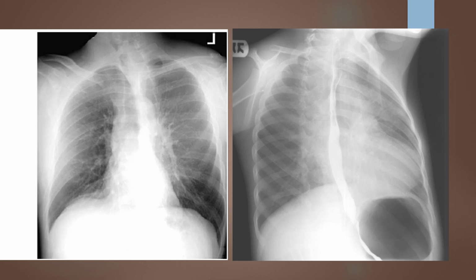So I know this was an oblique chest, therefore I should see twice as much lung field on one side of the vertebral column as the other, and they look almost identical. That means that this patient is much closer to an AP or PA than they are to a lateral, indicating that this was an under-rotated oblique. So with that being said, this is a repeatable image, but I'm going to go ahead and see if I need to adjust anything else.